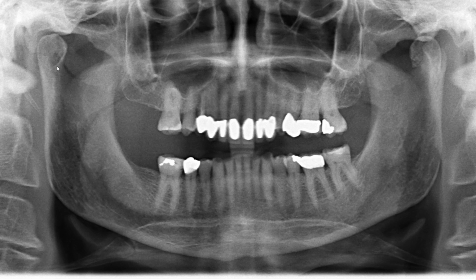This border as well, there's that border of the condyle as well as the sigmoid notch. But overall the cortication of this condyle and how it joins with the sigmoid notch is different from this side. So having said that, now let's take a look at this joint in cone beam CT.